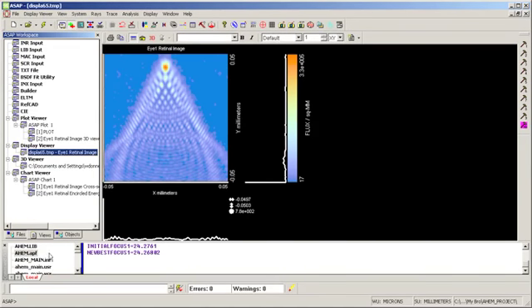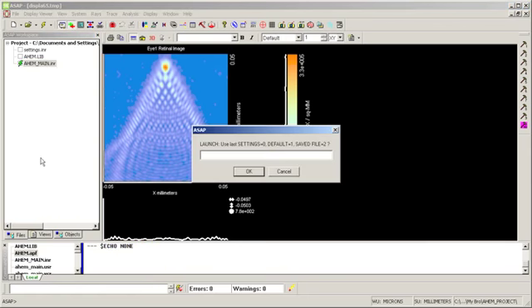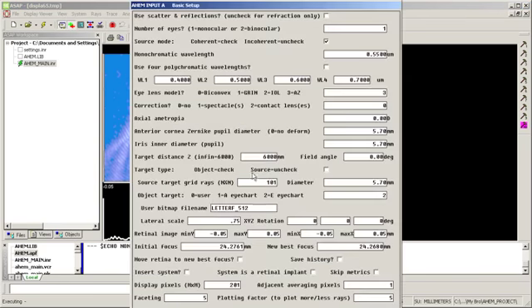So in order to do this, I go and load my coma aberration. I have a saved settings file. Say OK. Alright, so I've got a coherent mode as well now, so I have that box checked. I've got an anterior corneal Zernike pupil diameter of 5.7, which is the same as the pupil of the iris. So I'm going to deform over that cornea with some coma.